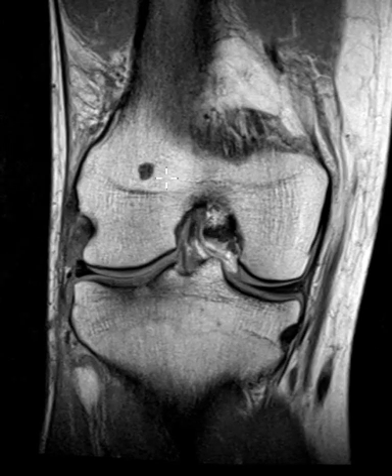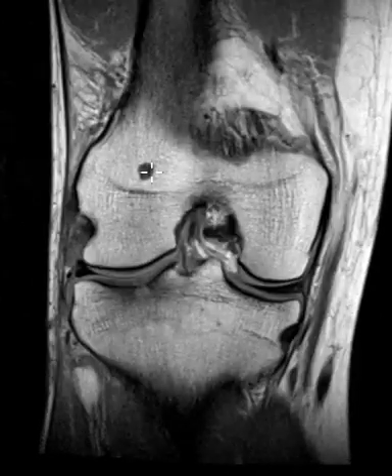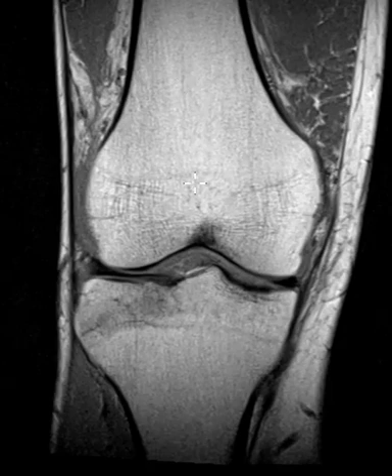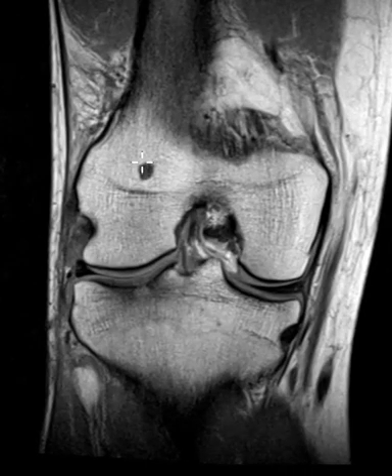The patient had a couple little round things. This is one up here that's just benign. This is a little benign bone tumor called an enchondroma. It's in the femur, this big bone here. Very, very common. It's a very small lesion with sharply defined margins, no abnormal signal in the surrounding fatty marrow. And these are, again, very, very common and of no clinical significance.